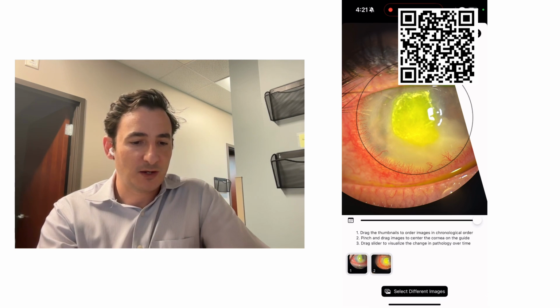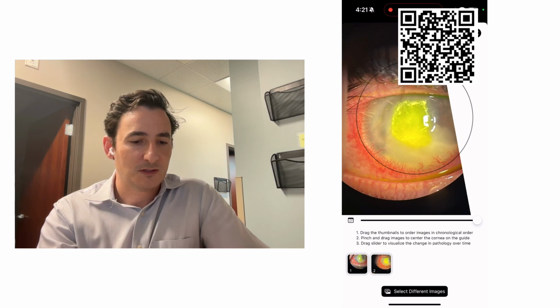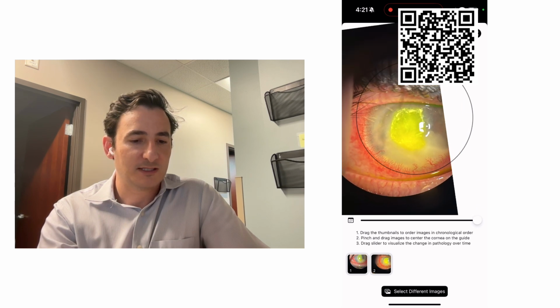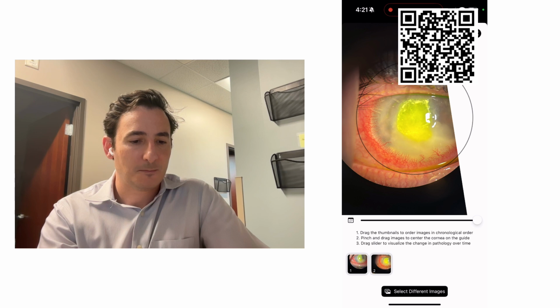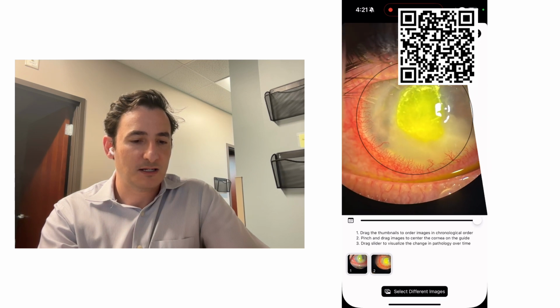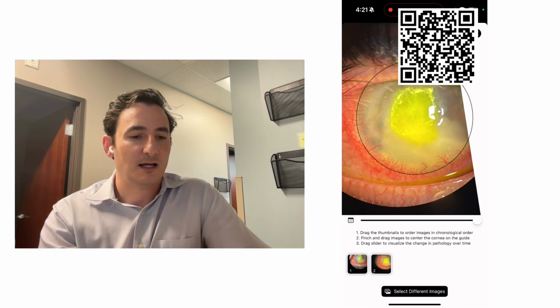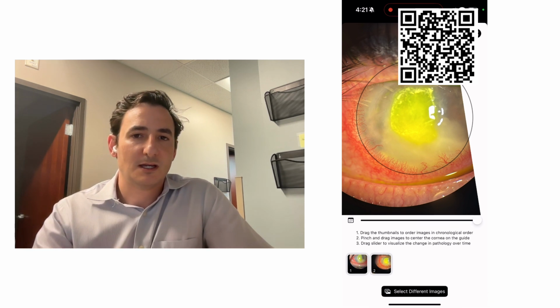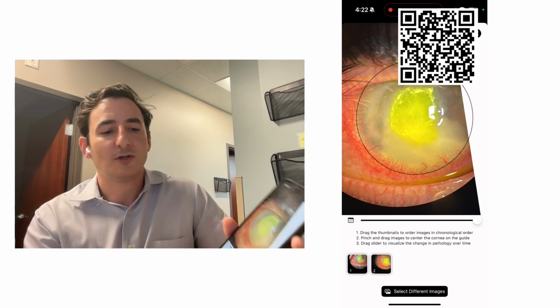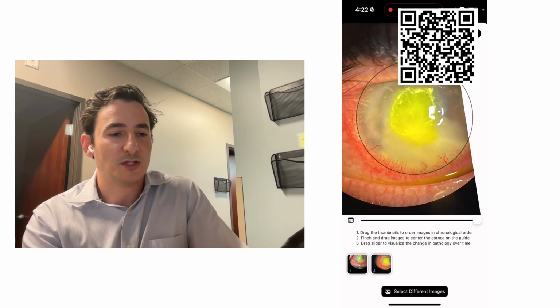And if you can remember, that one blood vessel was at about 6 o'clock. So I'm just going to try to rotate it to about 6 o'clock, and it takes some time to get it lined up adequately, but that's about 6 o'clock. And then what you're going to do is you can tap the thumbnails to jump, so you can jump between the 2 images to see the difference.